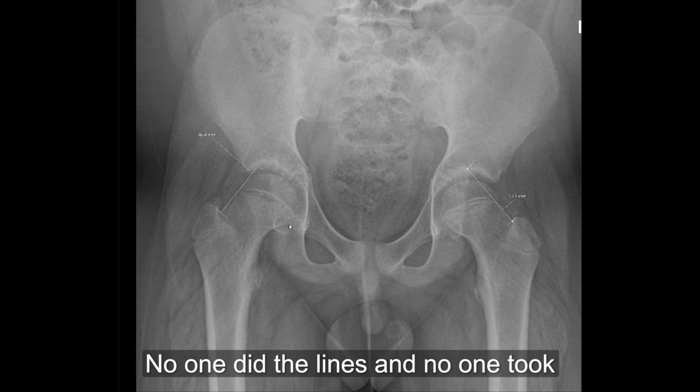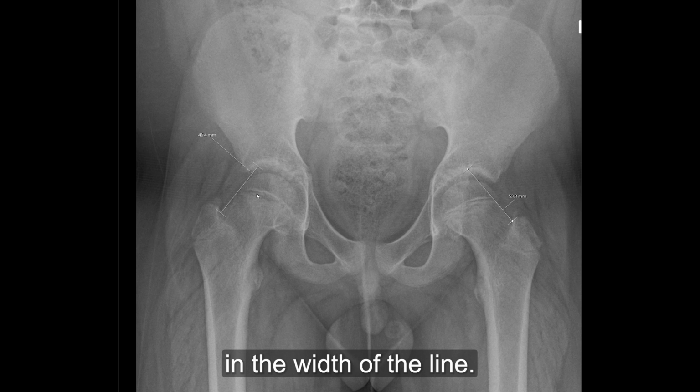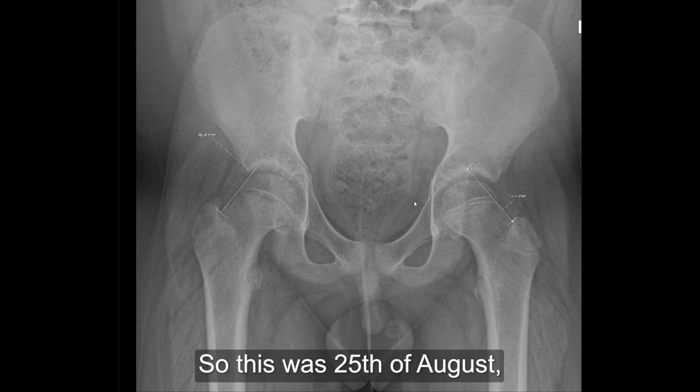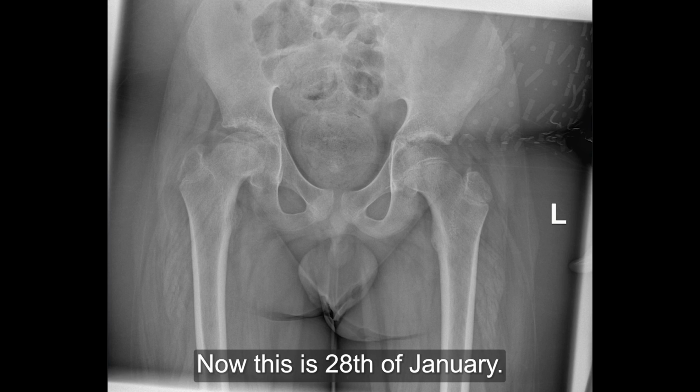No one did the lines and no one took notice of the subtle change in the width of the line that should be as narrow as this side here on the left. The patient then presented on a different day. So this was 25th of August, as you can see down here, presented on a different date and came with this. Now this is 28th of January.